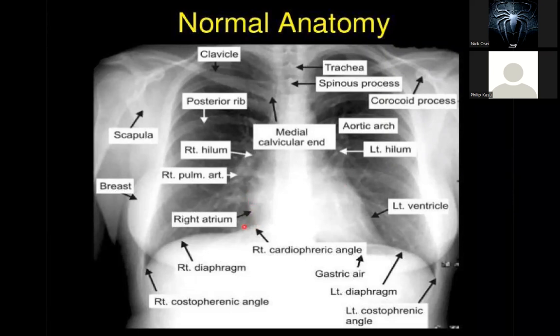Okay. So the angle that the heart forms with the diaphragm is called the cardiophrenic angle. So the ability to see them clearly means that there's no effusion on this X-ray. Then also another very important thing we use to look for is the stomach, the gastric bubble. So you can see some radiolucency under the left hemidiaphragm, and that is the gastric bubble.